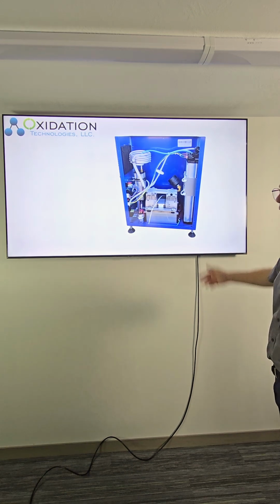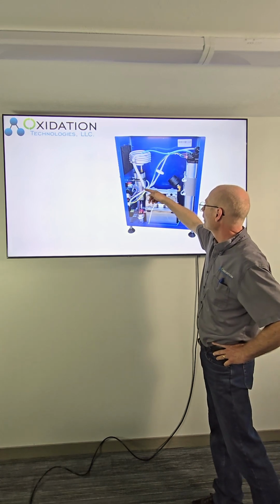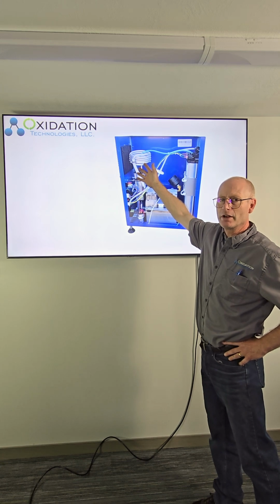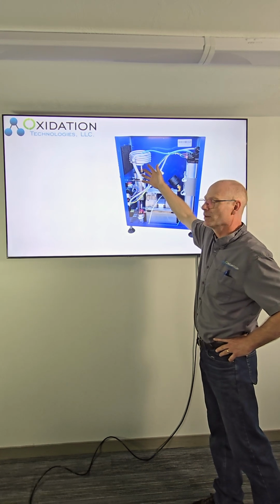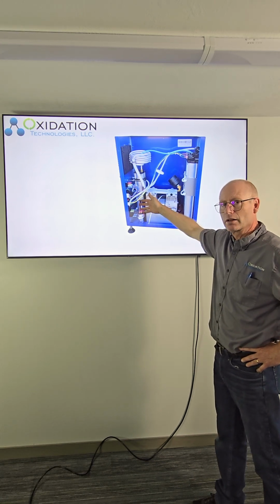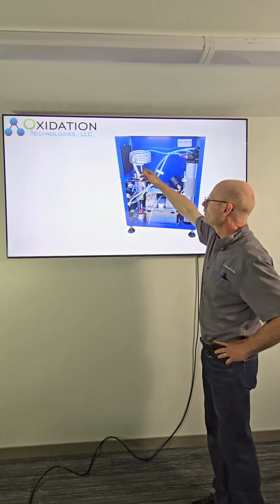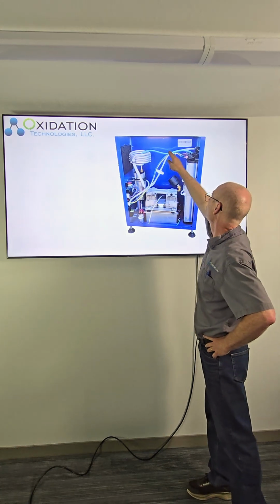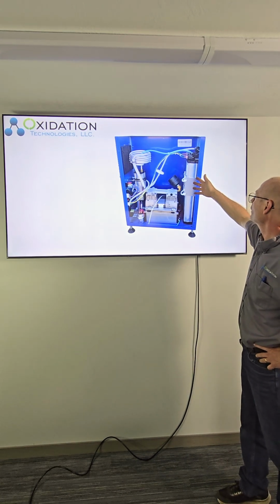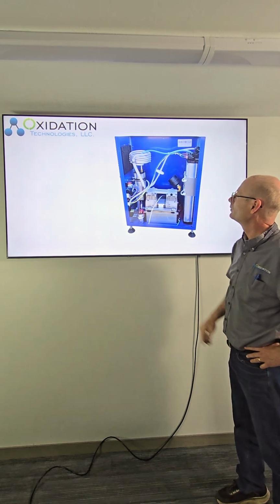Putting it all together, if you open up an oxygen concentrator, we see the compressor. Compressed air pushes up. This here is cooling it down. We're trying to remove some of the moisture. We cool it down, the moisture condenses into this little tank here, and comes out in a wick so that moisture is removed. Dried air comes out of this little bluish tube fed into the oxygen concentrator. And we'll talk about the inner workings here. The oxygen coming out is coming out of this white tube.